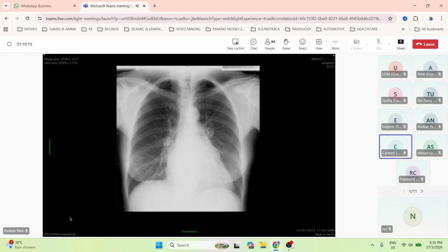Another is heart failure, but I do not see any pulmonary edema changes. I'm also thinking of pulmonary arterial hypertension, however the bilateral hilars are quite clear. There's no lobularity seen. I don't see any prosthetic valve.